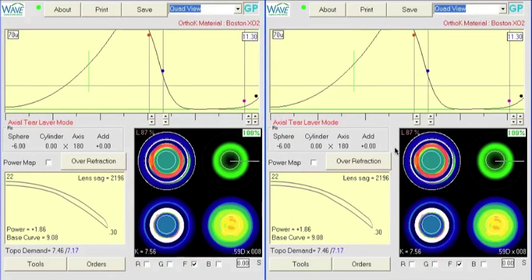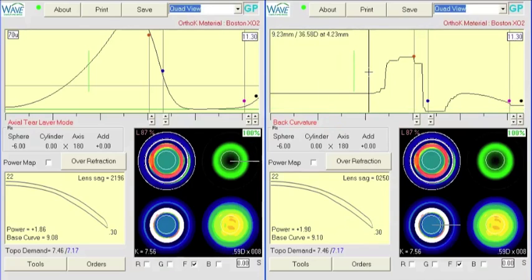And right now we're looking at the left eye. Again, it's the same lens in both eyes. And in this topography rather, you can see that the corneal cap here is noticeably larger than it is in the right eye. And if you run through the measurements, about 4.2, and 4.1, 4.2 there.